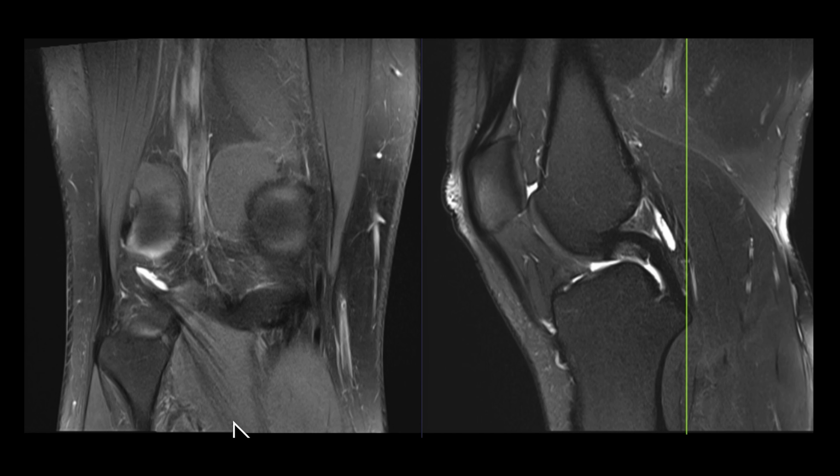PCL tears usually present differently to an ACL tear. It's quite rare to see complete discontinuity of the ligament, but what you might see is increased fluid signal intensity within the substance of the ligament or thickening. Even though you don't have disruption of the fibers, we will classify that as a tear, whereas there's some variance in the ACL, so we don't always call everything we see fluid-wise in the ACL a tear. It might be something like a mucoid degeneration, whereas in the PCL, you have a much lower threshold for calling a tear if you see signal intensity within the substance of the ligament, even though the contour is normal. And we'll show you some examples of that in the course.